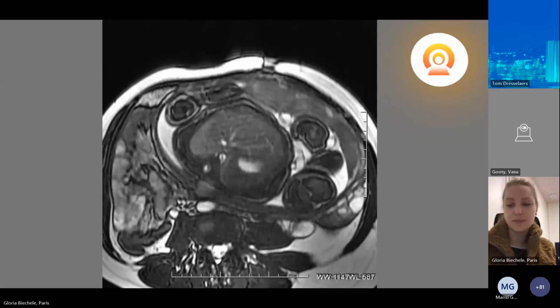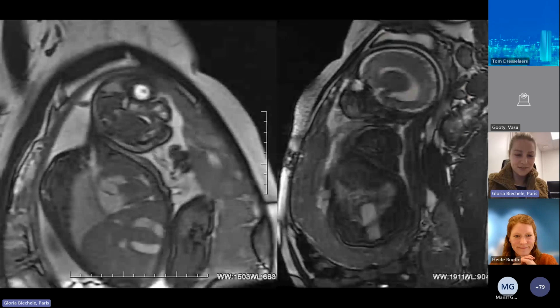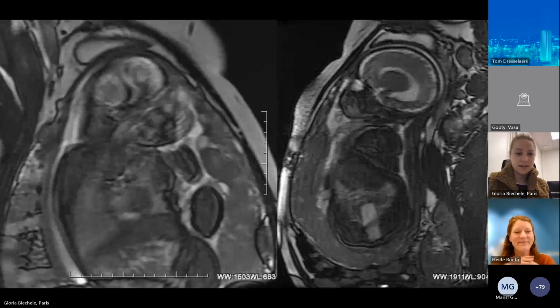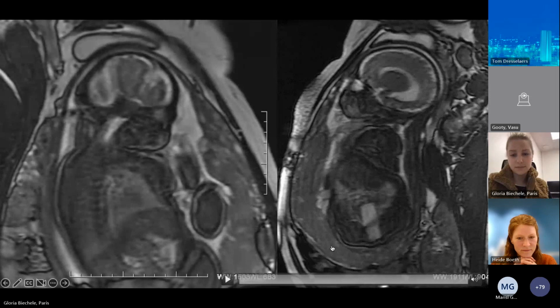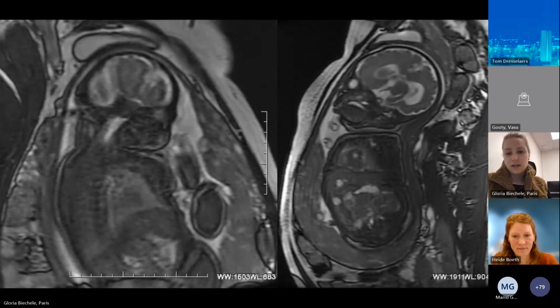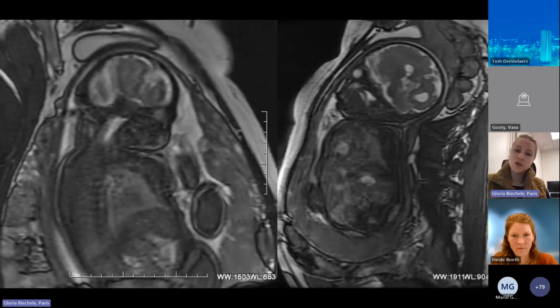So, in the following, I would like to show you some of our failed tries, as Heidi encouraged us to do so. This sequence started good, with quite some movement artifacts at the end. The next sequence already started with movement artifacts here, and got worse and worse.